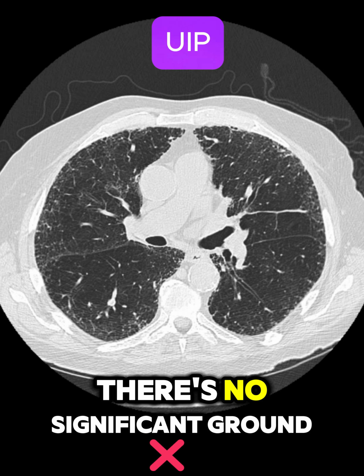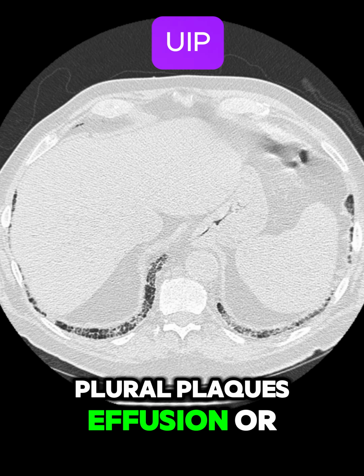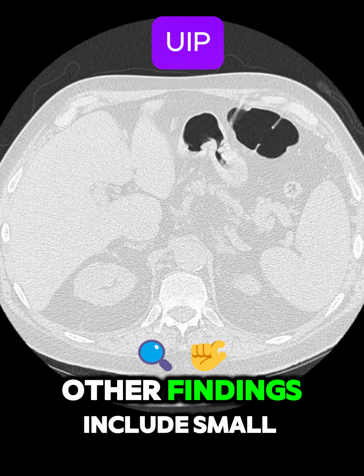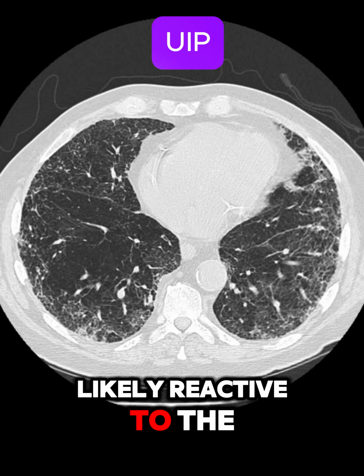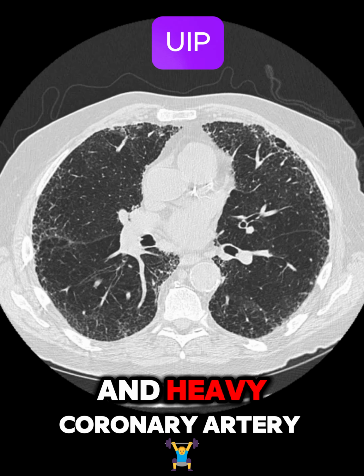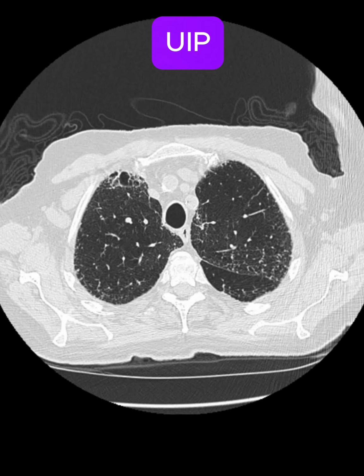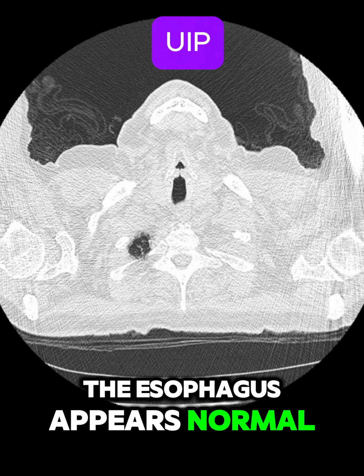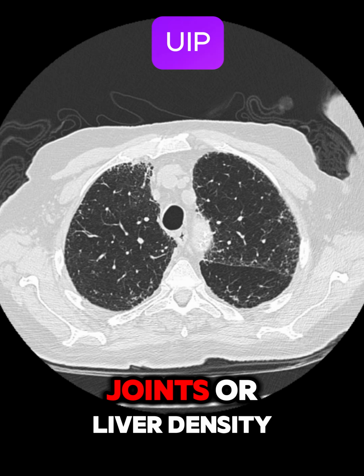Notably, there's no significant ground glass opacification, pleural plaques, effusion, or lung nodules. Other findings include small volume mediastinal lymph nodes, likely reactive to the fibrotic process, and heavy coronary artery calcification, which is incidental but clinically relevant. The esophagus appears normal, with no signs of dilation, and there are no abnormalities in the glenohumeral joints or liver density.